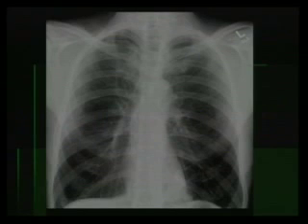Pulmonary sequestrations. When you have a recurrent pneumonia in the same spot, especially if it's at the left lung base or the right lung base, but especially the left, you have to worry maybe there's a pulmonary sequestration. Here, if you always look, we have seniors here in New Orleans who are about to take the test. If they show you a case and you're looking all throughout the lungs and you don't see anything, look to where we miss things. Look up in the neck.